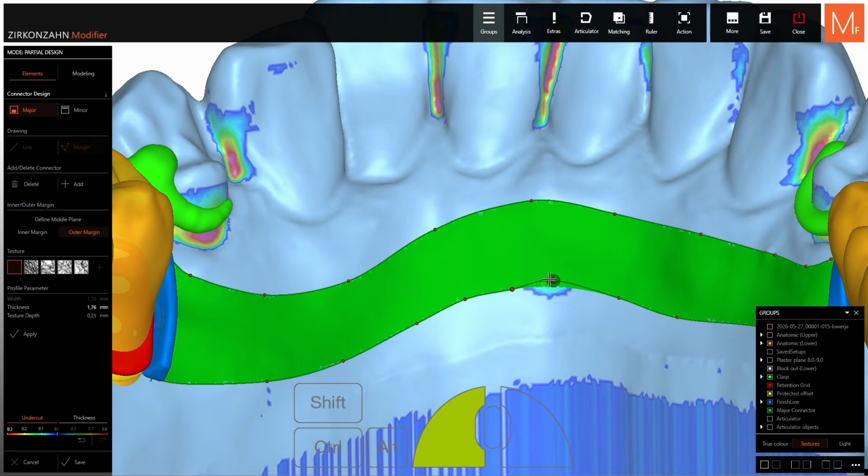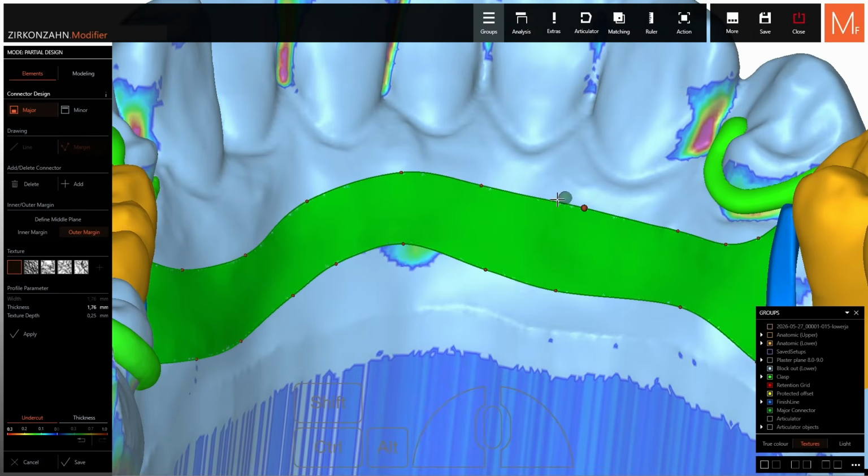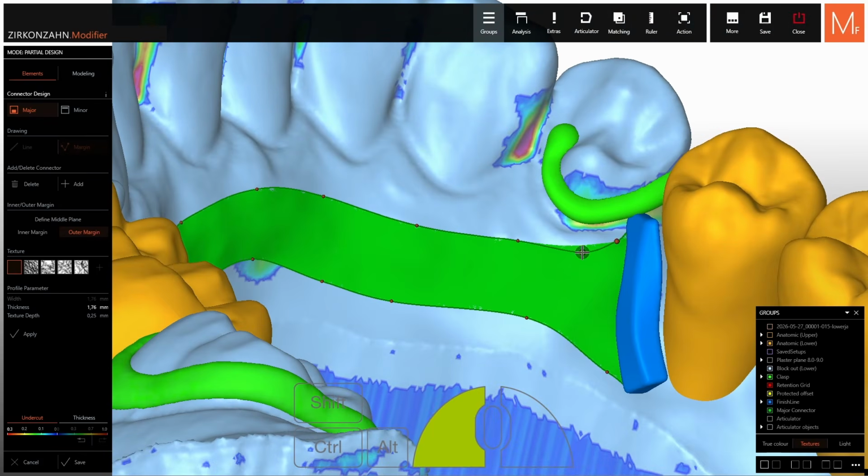As a small disclaimer, I designed these dental prosthetics you see in these videos, always to the best of my knowledge. But I still have a lot to learn, so please focus mainly on the functions I show instead of the shapes I design using them.